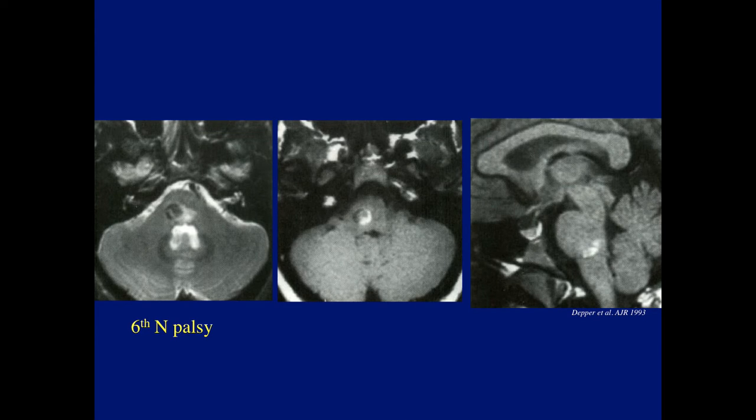What's the etiology here for a 6th nerve palsy? Correct. As Nate and Ben both said, cavernomas, which actually bled. So this is likely a cavernous angioma with hemorrhage, as we can see because of the bright signal, a combination of the dark and bright.